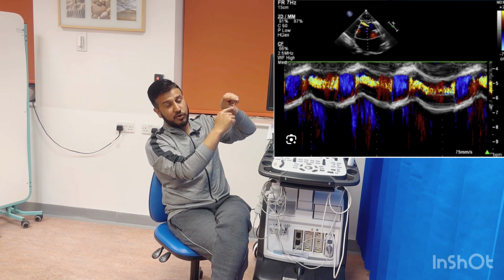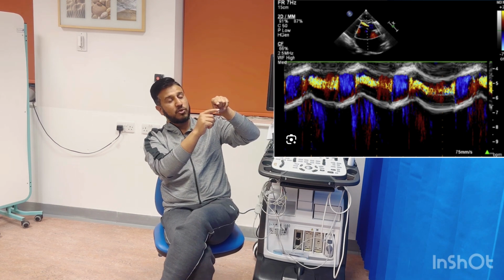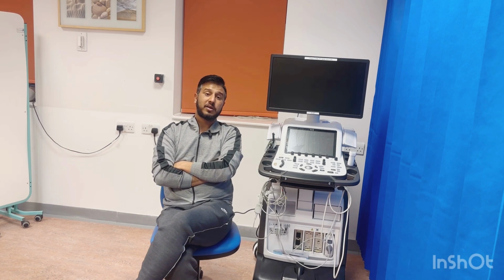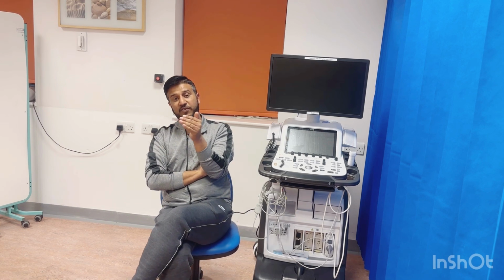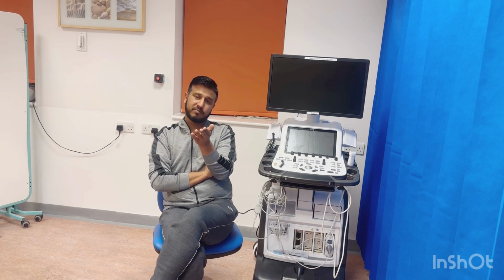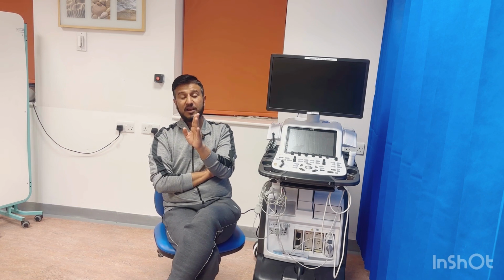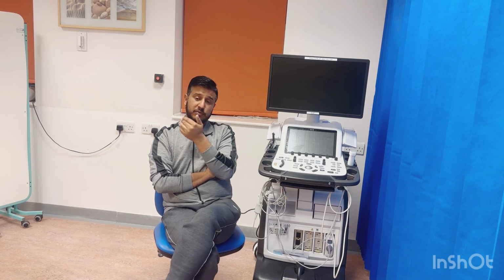You get the diameter of the LVOT, for example, it's 2, and you get the regurgitant jet diameter, for example, it's 1. So it means you have 50% covering, and it could be significant. If your jet is covering more than 60%, it means it's a significant aortic regurgitation. Again, if the jet is quite eccentric, then this is not reliable as well. You don't need to change your baseline or color scale for this one either. Same color scale.